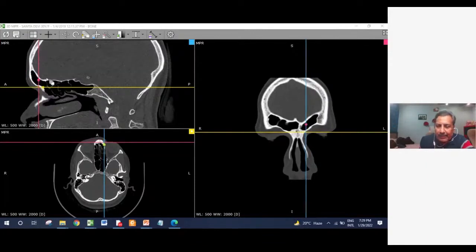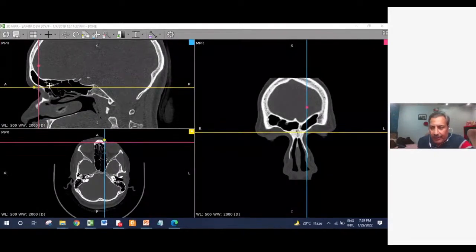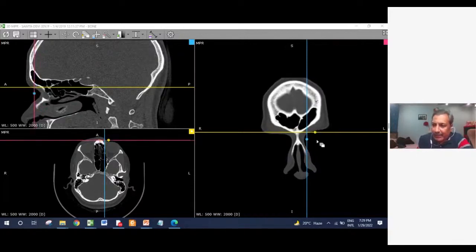Sometimes we have patients with a CSF leak from the frontal sinus, posterior table, skull base somewhere, and you can get very good information from a multiplanar fine section CT scan about where the leak is coming from, and what approach can be used. Yes, more and more CSF leaks from the frontal sinuses nowadays are being tackled by an endoscopic approach, and here your CT scan anatomy will dictate whether it is feasible by endoscopic or not, or whether it is appropriate to do by endoscopy or to go ahead with the open approach. So that decision making is very important on the basis of the CT scan.